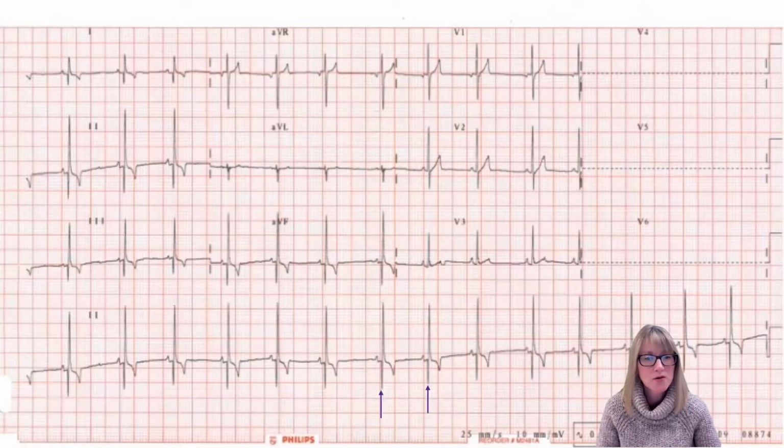So what about doing an instantaneous heart rate? That is selecting any particular cycle and then counting the time between those 2 heartbeats. Well, we can break down the math to actually become pretty easy as well. So here I've got 2 heartbeats selected with the arrows, and I know that in between those 2 is 16 little boxes or 16 millimeters.